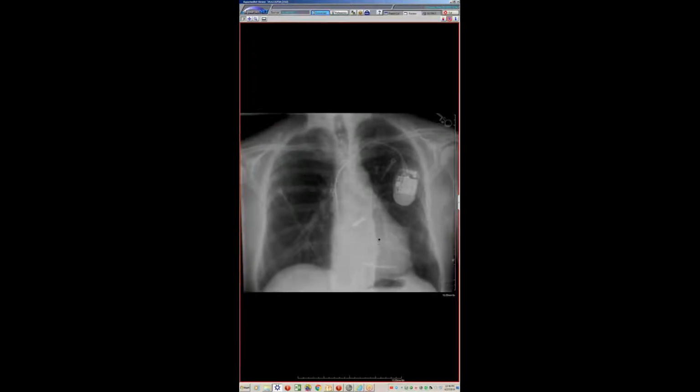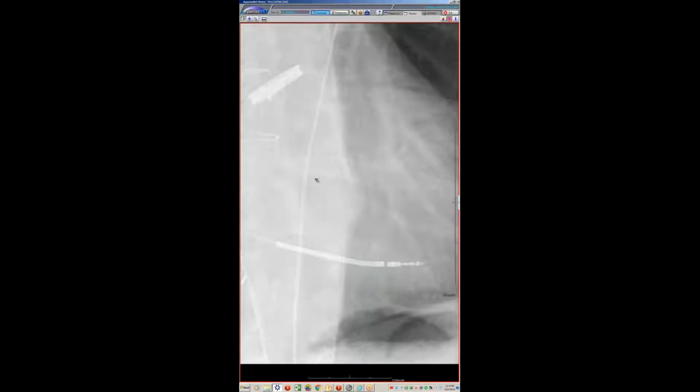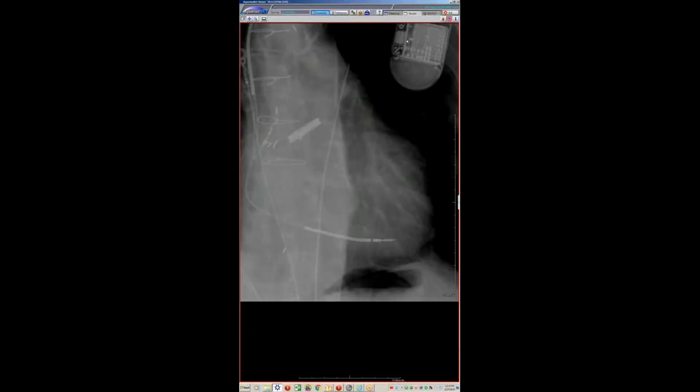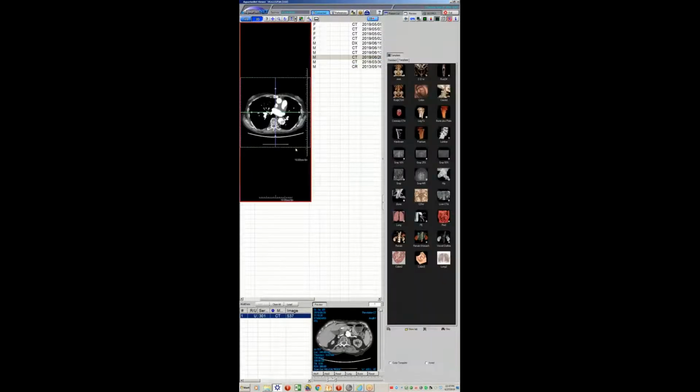defect, where there's lack of calcification, here you can see better. The whole thing is heavily calcified, and on the next one, you can see that this defect has gotten larger with a larger outpouching from the aorta. It's a really nice chest X-ray, and I happened to get lucky that day and pick it up and sent him for a CTA.